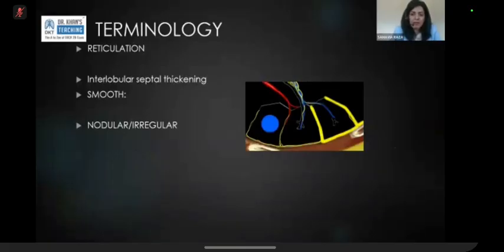In that setting, that patient whose heart looks healthy, doesn't have coronary calcification, and has irregular nodular looking septal thickening, that is the patient that you're going to think about lymphangitis carcinomatosis. It's not the most common diagnosis, but when it's clear, it is very significant for the patient. It implies a very bad prognosis. So be very careful when you imply that on a scan.